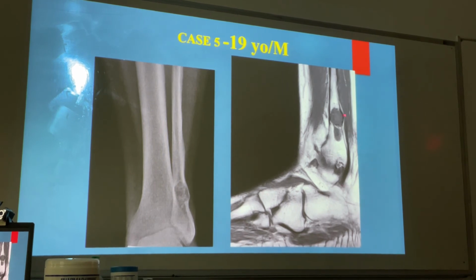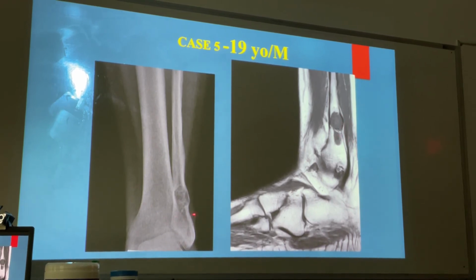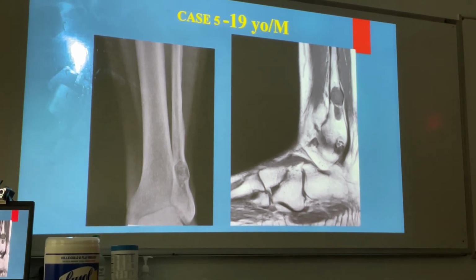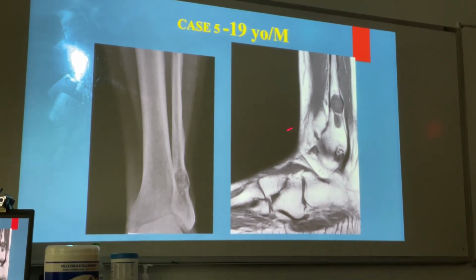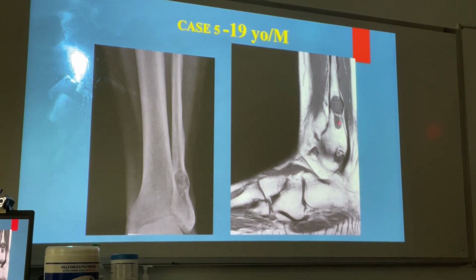Now, what does the MRI add to it? The MRI, this is what we see, the outpouching or the expansion, but I can't see this nearly as clearly on my plain film as I could on the MRI. So it's actually bigger. That's the point to it, okay? Now, is that osteomyelitis or? No, don't go there just yet, okay? It's not normal, it's not a normal variant. But what does this add? It adds size. This corresponds basically to this. This is an extra component that belongs to this.